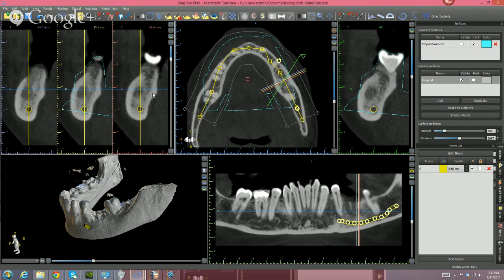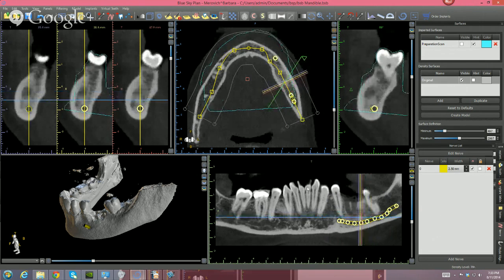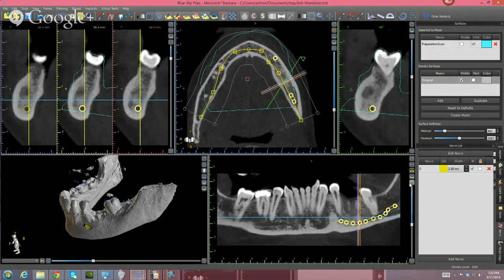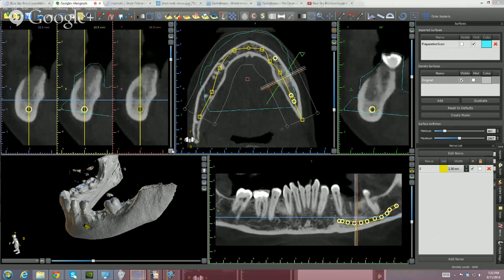About the submandibular fossa, I'm going to step around here for a second. I want you to take a look at that area and notice how dense the bone is there. I'm going to keep stepping around, moving forward. Okay, this is what I wanted to do. Let me just step around, and I want you to keep watching how dense this little corner is.